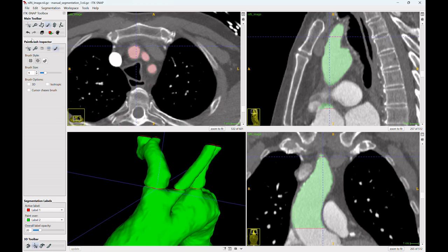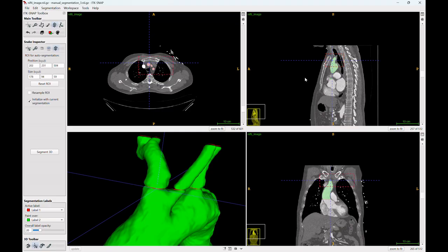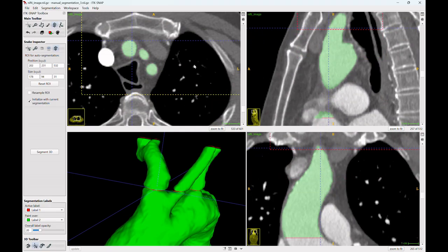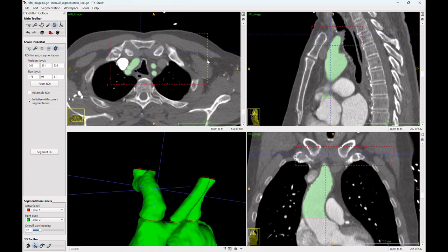Define the region of interest for the snake by outlining the 3D box around the targeted area. Make sure that the top and bottom edges of the 3D box exactly match the slices you manually defined at the beginning.